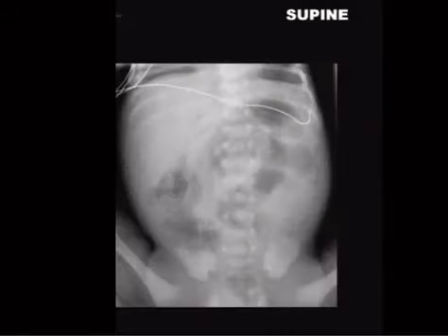All right, next case. We've got something that sort of looks like we might have some NEC going on here, some bubbly stuff. So how can you tell if it's NEC versus poop? Practical pearl is you call up the floor and you say, has the kid eaten or not? If he hasn't eaten, he doesn't have poop, and then it's more likely to be NEC. Sometimes you just can't tell and you just have to watch for serial imaging. You know, is that bowel loop staying similar? The poop should move, right?